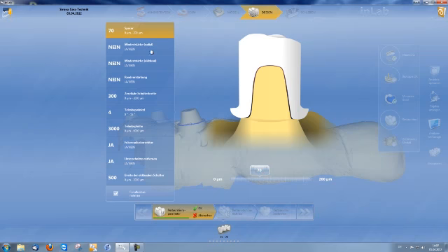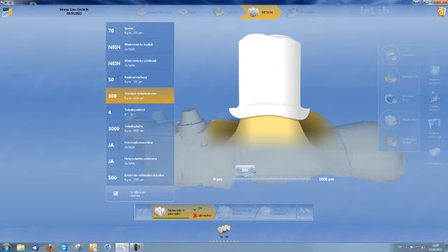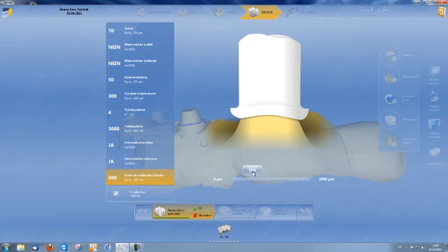Radial occlusal material wall thickness as per the manufacturer's instructions. Margin reinforcement. If no reinforcement is desired, I can also change this. Cervical shoulder width of my telescope. Telescope angle. Telescope height. Milling radius correction. Remove undercuts. Should undercuts occur, the software would block these out immediately and the width of the occlusal shoulder.